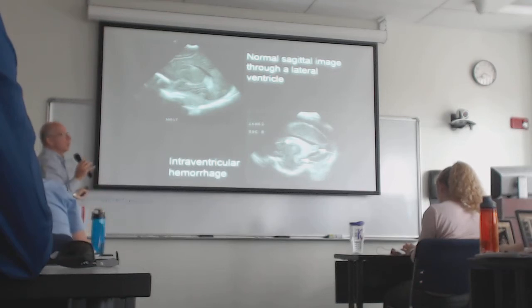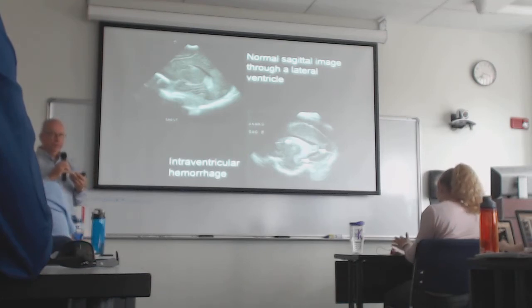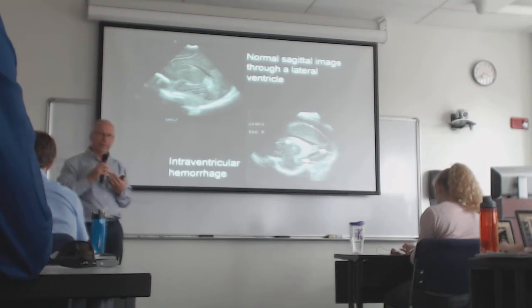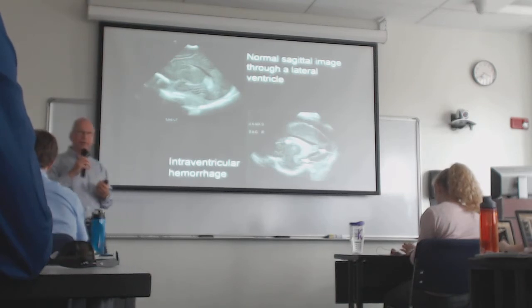So what I want you to know about neonatal ultrasound is that it's cheap, it's easy. You're looking for hemorrhage in the infant brain, and the infants that you're scanning tend to be premature because they're at higher risk.